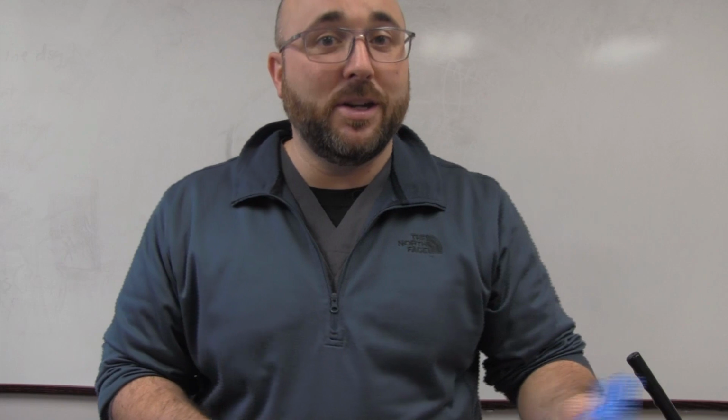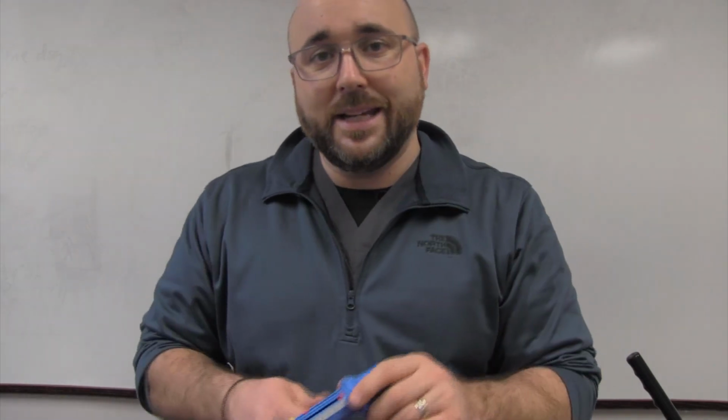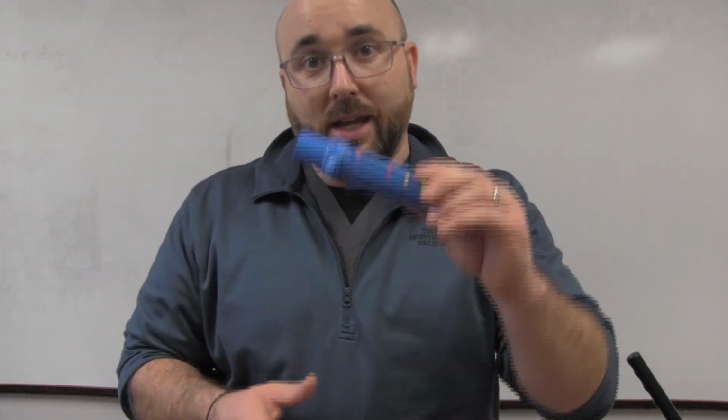And maybe you use it, maybe you don't. But I'll tell you, if you can prevent exacerbations and you can have a number to go with the fact that you feel like you're getting short of breath, that's really important when talking to your physician or provider and getting the next steps of treatment going forward. So, peak flow, there's a lot of teaching to it, but that is what it is all about.